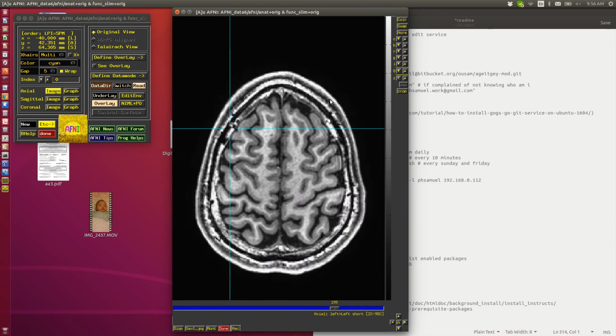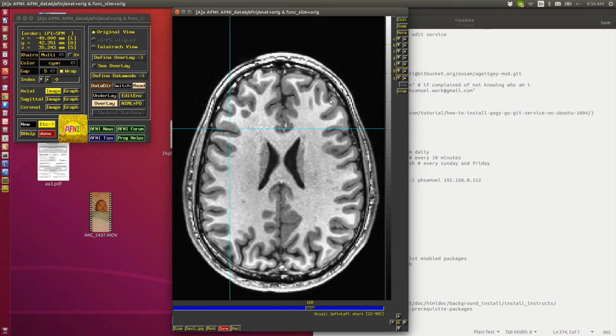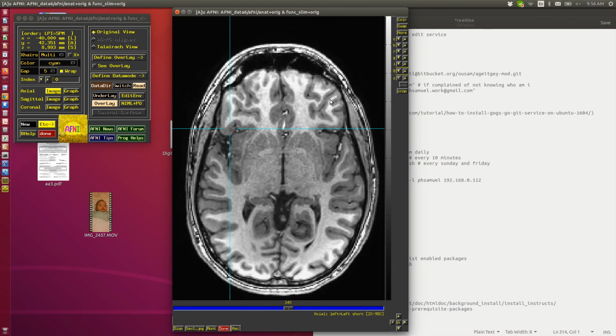Typically, if you're producing an image for production, like putting it in a paper, you'll produce images in AFNI and save them, but then you'll probably post-process them in some graphics editor to put captions on and maybe make them look a little better. But we don't really do that, because I don't want to spend all my effort competing with Adobe. They have more budget than I do. So that's the stuff on the right side of the image viewer.